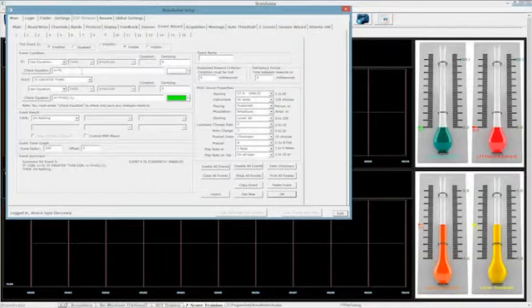But it gives you that flexibility just in case something happens. For example, there are people out there who will use different bands and different things for different purposes, functions, and names. The nice thing about these right here is you never have to worry about them. You can put in those changes and they will always be there.